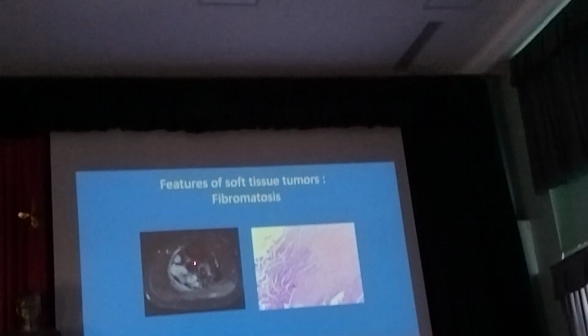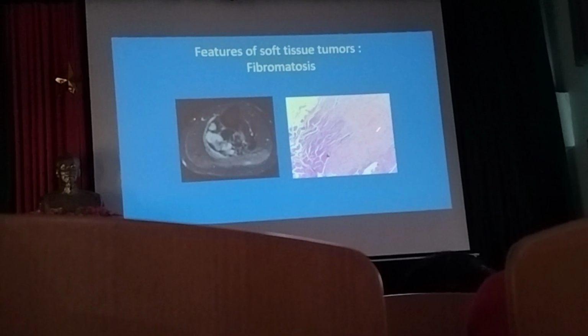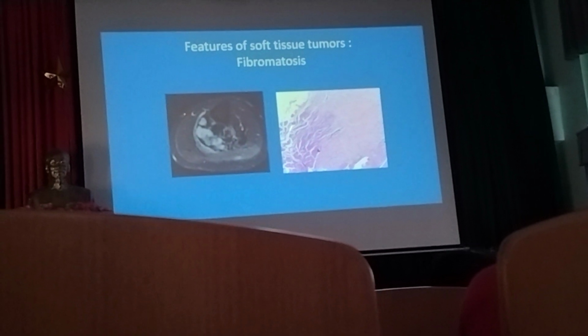Okay, so this to show you that dark signal here corresponding to fibrous tissue with integrated with normal muscle.